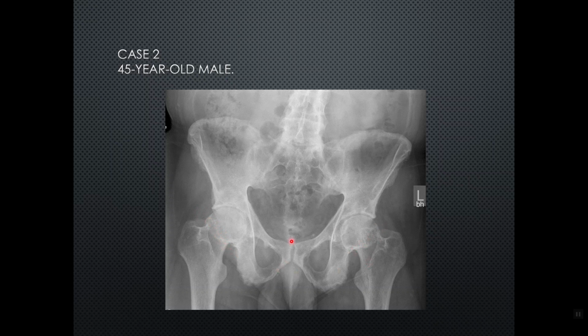The symphysis pubis is another area not clearly seen in this case, but certainly there is that whiskering and proliferation, plus changes in the sacroiliac joint. This is advanced disease, by the way, and you can see some increased sclerosis affecting the facet area. That's known as the trolley track sign, and that's ossification of the facets. Later on we'll see it more clearly than in this case. And of course, there is bridging of the spine itself with marginal syndesmophytes forming that bamboo spine known for ankylosing spondylitis.